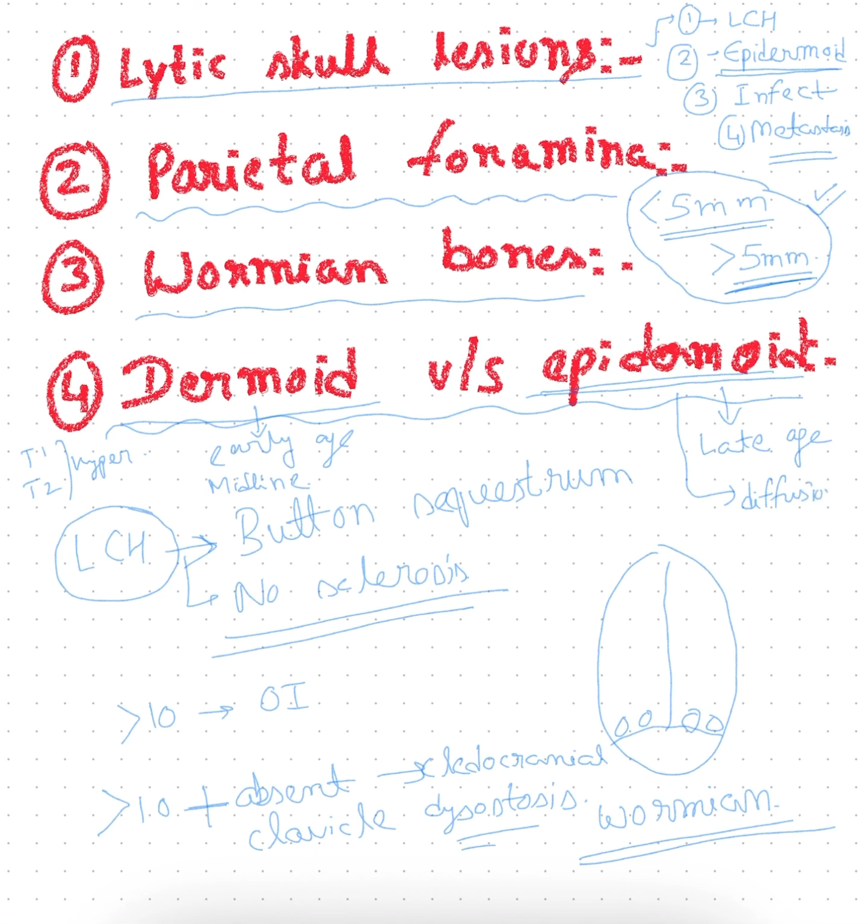That is a key point. The wall will enhance in the dermoid, and similarly calcifications will be there in the dermoid. These dermoids can be associated with some kinds of encephalocele. So these are the basic key points by which we can differentiate or reach the diagnosis in these lesions.